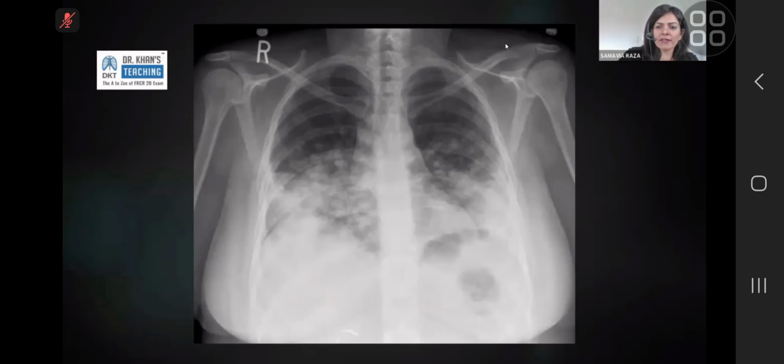Okay, pausing there. Somebody said lung nodules, question mark, septic emboli. When you want to say septic emboli, you want to see some cavitation. Somebody said heart failure or pulmonary edema. I've forgotten which one. But either way, I would really want you to look at the X-ray again.